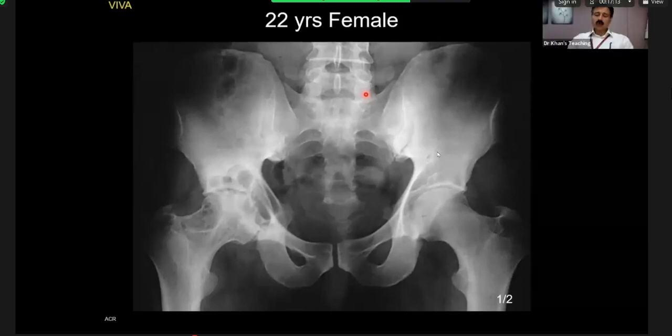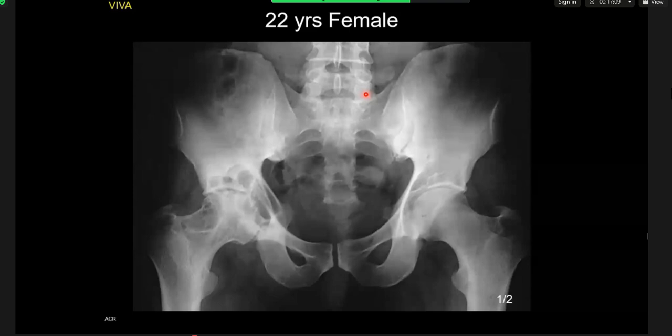Excellent. What is your conclusion? Well done. Your description is very good. Because of time, I want you to give me your conclusion. I suspect PVNS, which is pigmented villonodular synovitis. I think there are outgrowths from the synovium punching out the articular bones.